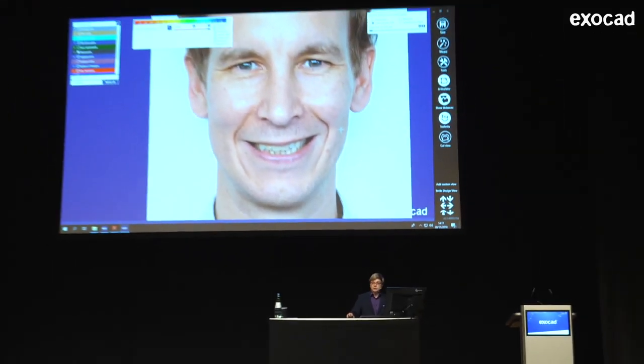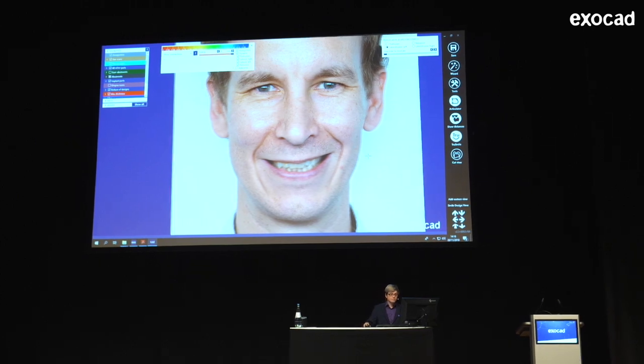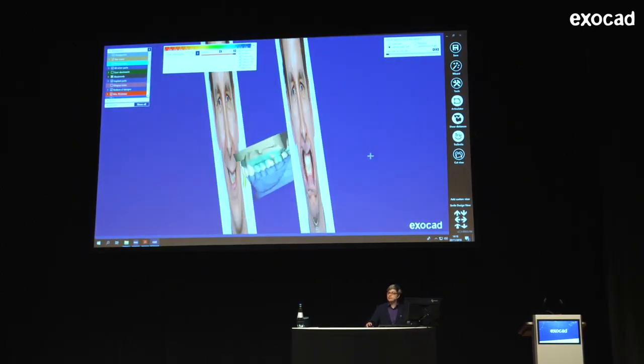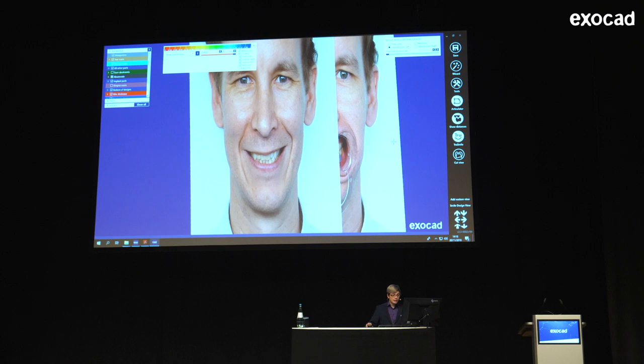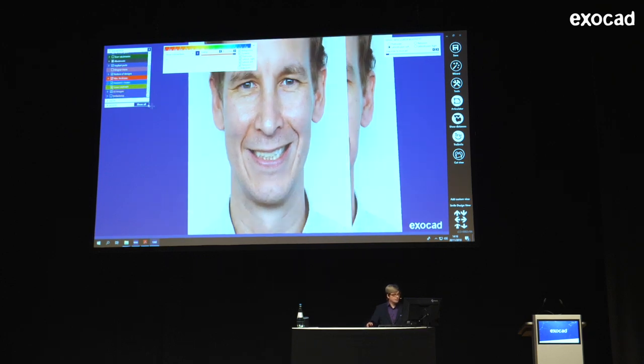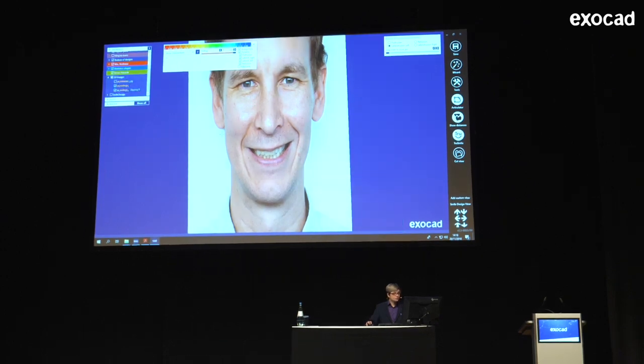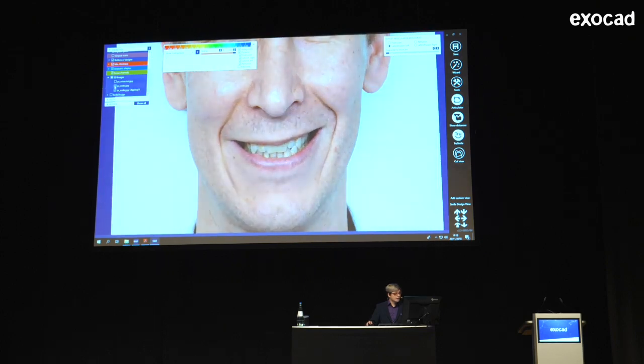And now you can actually see how the smile design works with the pictures, because if you tilt this, you see the model is just in between. And those pictures are now part of the project, and I can hide them, obviously, because here, those are the 2D images. And I can hide the retracted one. And maybe interesting, I can actually hide the clipping of the smile as well.